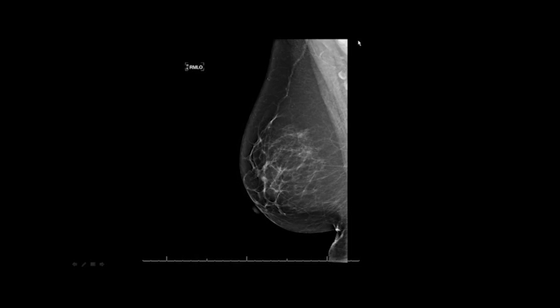Here's an MLO view. Wide superior with the convex border. You draw that 45-degree line to the muscle. Nipple's in profile. The bottom of the breast horizontal. The IMF is on there. It's got a little bit of fold. It's not perfect, but this is not a bad image to use. I would use it.